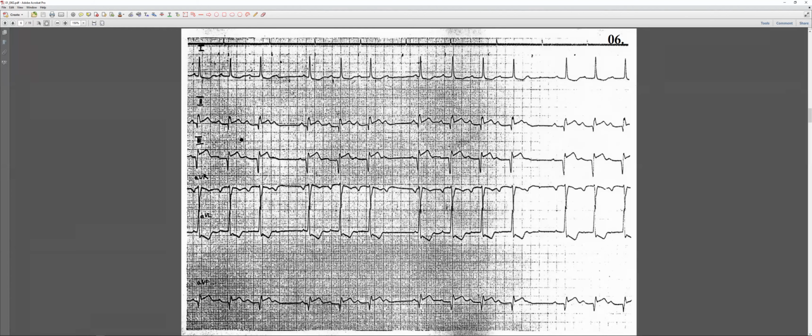Posterior, the reflection side on the V1. No, yes. V1, V2, V3. So relative to the chest leads, the anterior leads can be used to figure out the posterior wall.